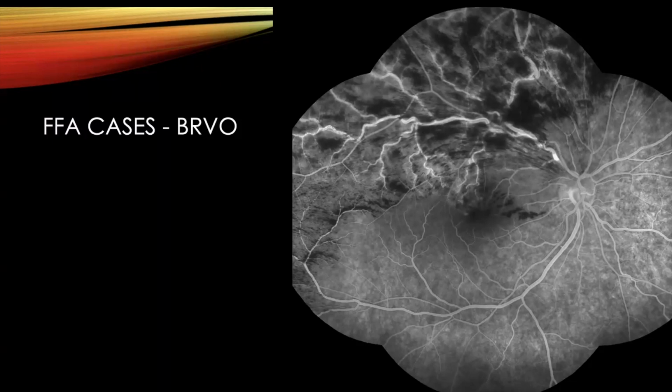There are certain findings that put a branch retinal vein occlusion in a high risk category, and that specifically, for example, is having over 5 disc diameters worth of ischemia, disc area, sorry, and then with a central retinal vein occlusion, that's doubled to 10, and that gives you a highly ischemic eye, or an eye that is more likely to progress to have complications of a retinal vein occlusion.